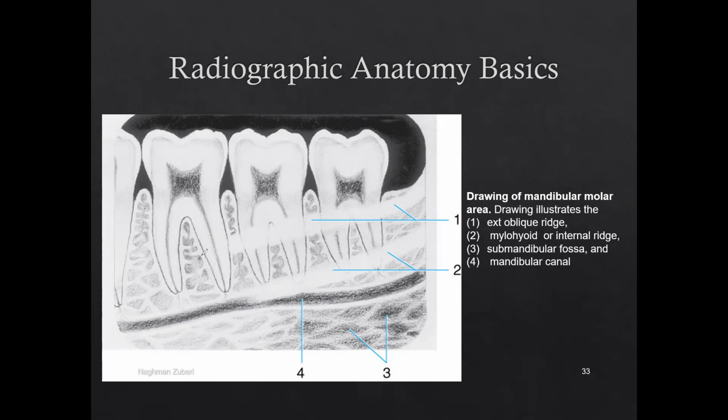At times they can ask you about just an accidental finding, very obvious radiolucencies over here, but the apices would be quite sharp. That would be the traumatic bone cyst. There is no fear in saying that it is a traumatic bone cyst. If you see it very clear cut and the apices are sharp, not resorbed or undermined due to the pressure of any cyst, then those are the traumatic bone cysts or simple bone cysts.